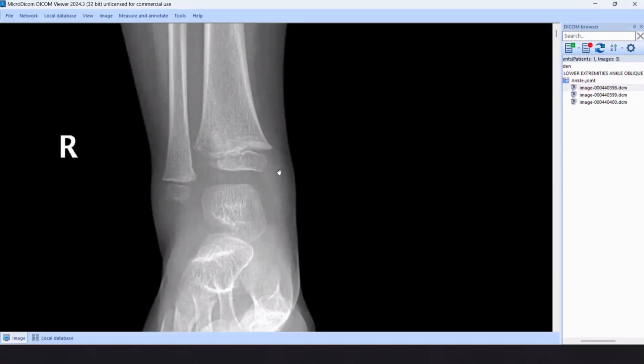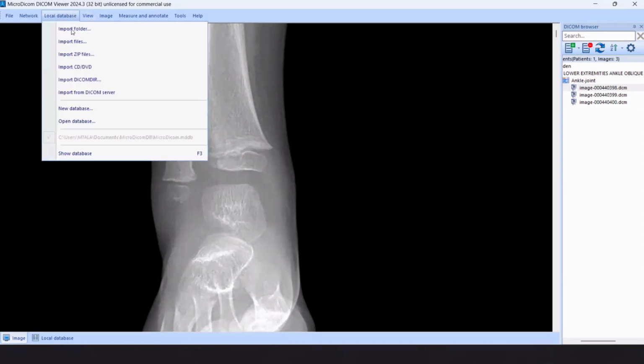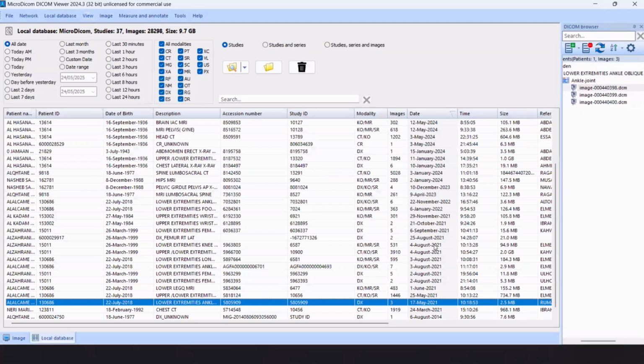We have AP and frontal radiographic examination for a skeletal immature patient, and as you said here, we have something abnormal along the lateral aspect of the distal tibia. Do you agree with me? Yes. Okay, let's go to our second.